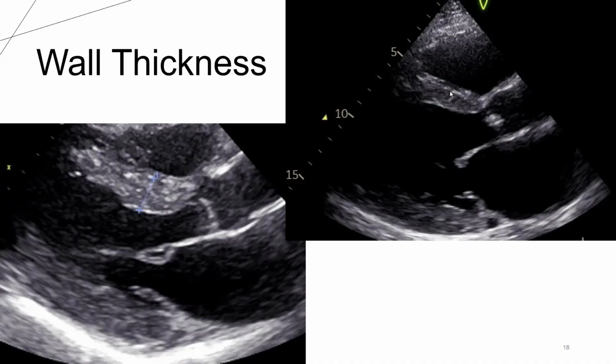And here, this one is about 11 or 12. That is the number that we use to see, well, is this maybe cardiac amyloidosis? The magic number is 12. If something is 12 millimeters, then we put cardiac amyloid on the list of things that might be wrong. Before that, all of the normal hearts you see are generally below 1 centimeter. A little bit thinner in women, but that's another discussion.